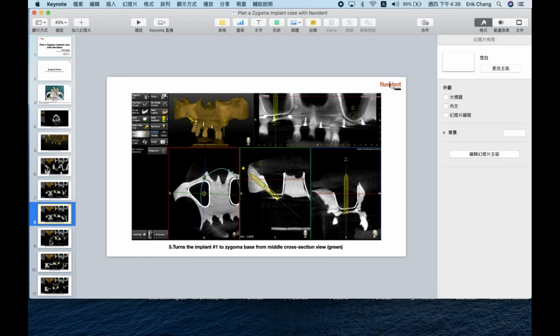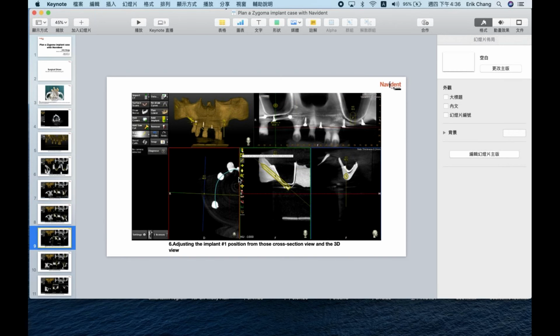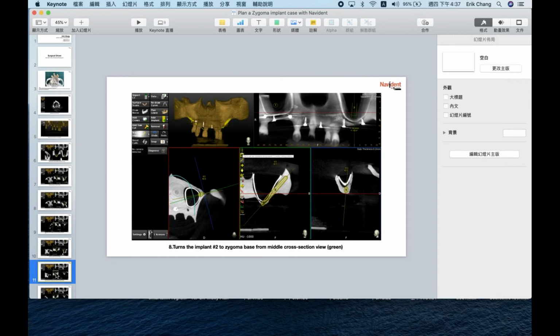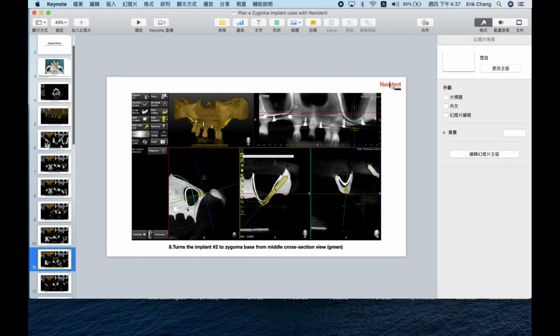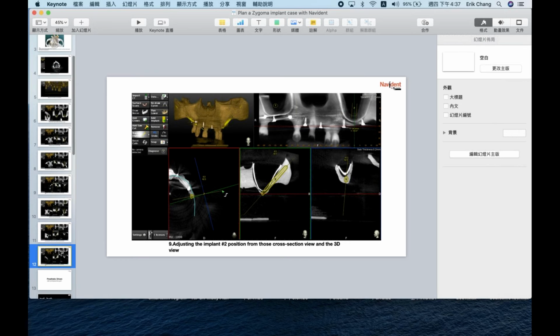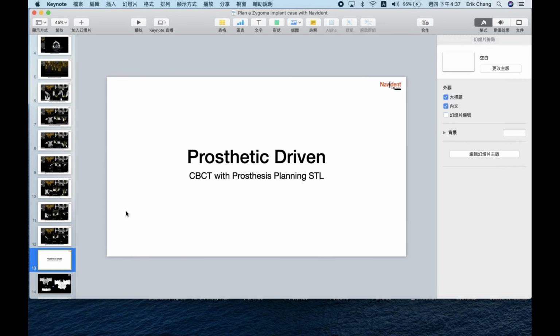Okay, so for number one, you basically place the screw, but the implant is not necessarily on the screw. Yes, it's correct, nearby the screw. Okay, good. And of course in the planning stage, it's much easier to define the location. If we are doing the surgery, it will also help us to find where is the entry point because it provides a guide for us.